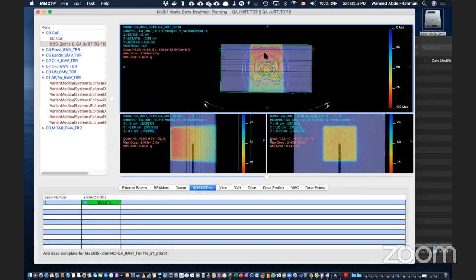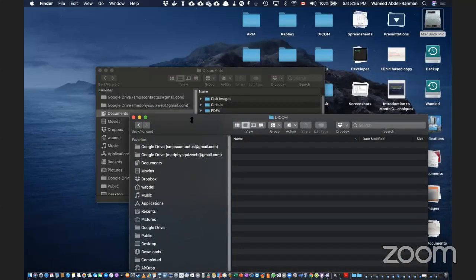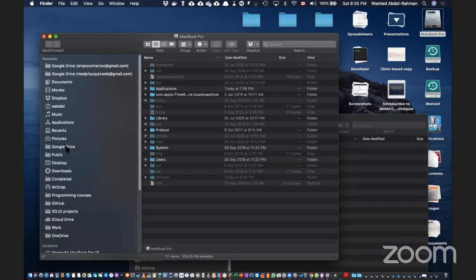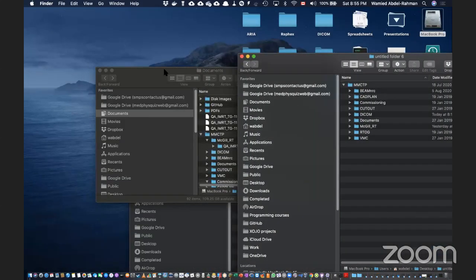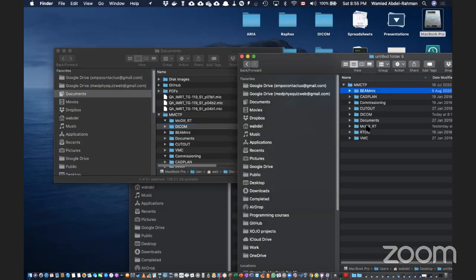So what I do is I do this for, let's say, this plan. Let me show you what I've done. If you give me just another 10 minutes, and then we'll be done for today. So on the desktop, here, let me bring up the folder that I have done. So that one, deleted, and particle.